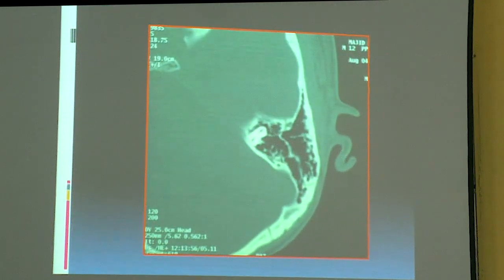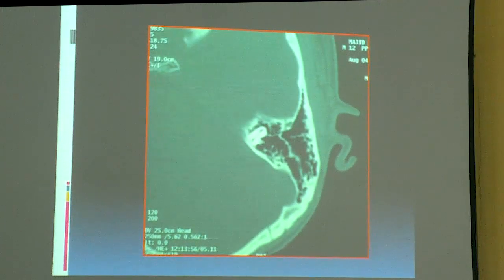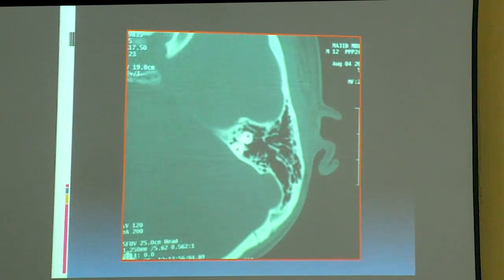Next we go a bit down, and this white line starts going into 2 dots because we are cutting it just a little below. Okay, we go further below and this is 2 distinct dots with a channel in between, which is the arcuate tract, subarcuate tract, right?